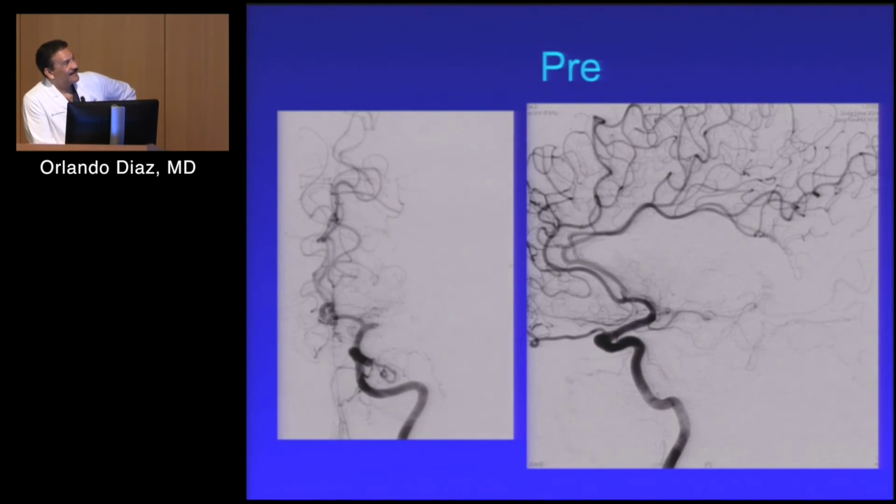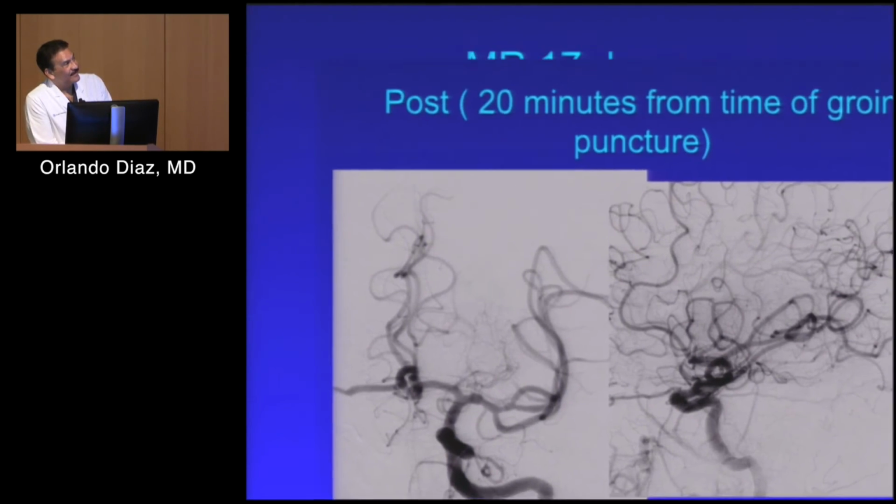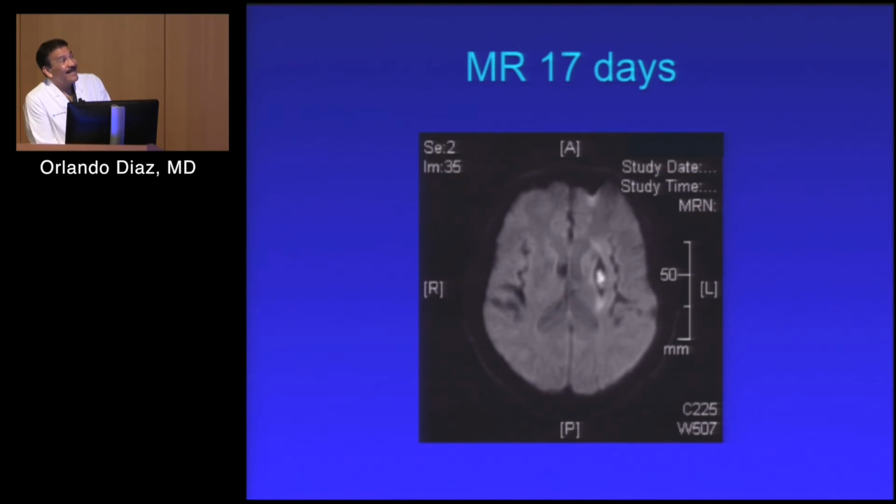Okay, here. What artery is this one? Internal carotid. And then should be a T. This is the ACA, and what is this? MCA, M1 segment. There is a little filling defect. I don't know if you see it there. There is a clot there. This is after I showed you this case. And the patient is going to have a stroke after the procedure.